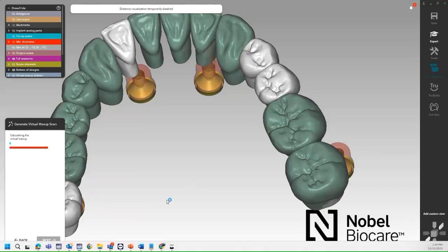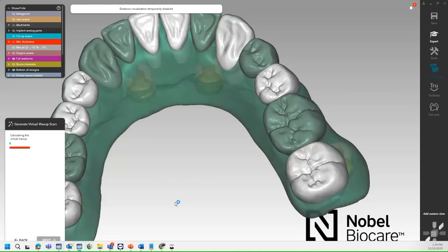And this is where you test the speed of your computer. Sometimes on slow computers, this can take a little while. Double arches are computing a lot of data.